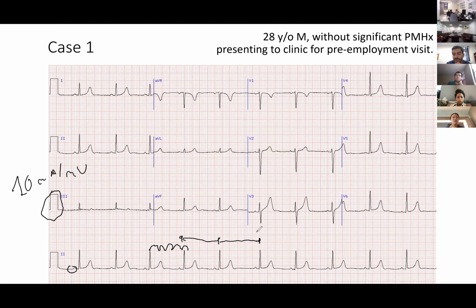Okay, so this patient has a little bit of sinus arrhythmia. Right? So the definition is actually if it varies more than 10%, which it does. But overall, it's the sinus beat coming from the atrium. What else? I then check the axis. So 1 and 2 are positive. So we have a normal axis. Correct.